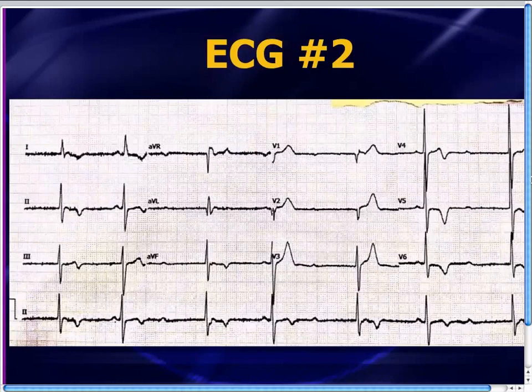So first of all, it's kind of a strange rhythm, and when you see these strange rhythms, what I like to do is just find the P waves. It looks like that's a pretty certain P wave there, and I'm pretty sure that's a P wave there. But that also looks like a P wave that's just kind of sitting out there. And so once you see a couple of P waves that you're pretty sure are clear-cut, what you do is you take your calipers and just start mapping it out.